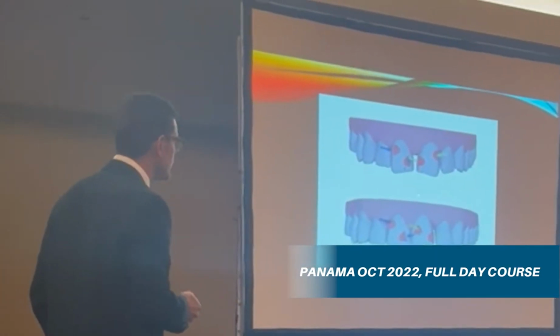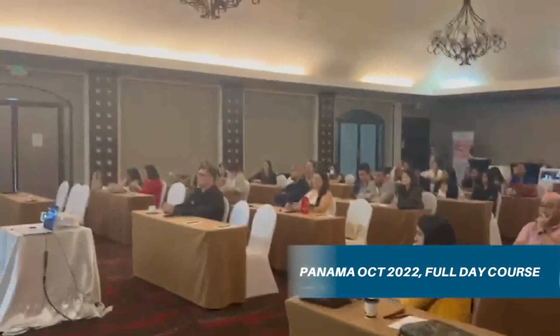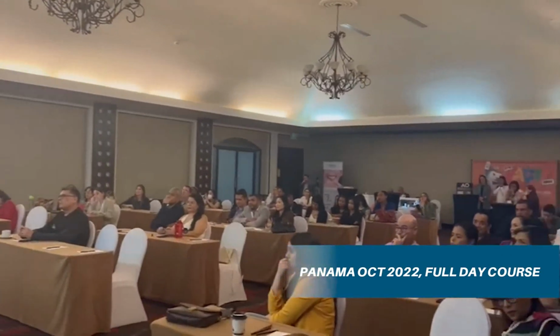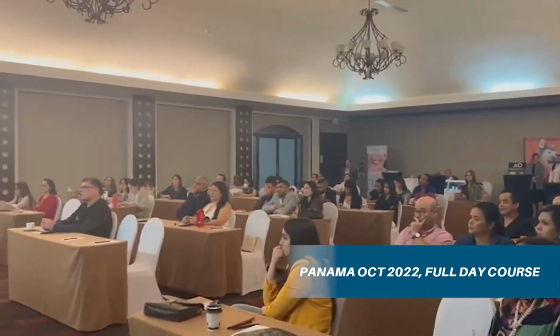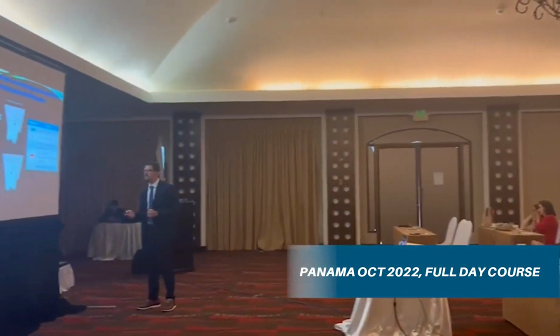From the occlusal view, look at the canine. Check the shape of the arch for good curvature, high protrusion, or lingualization. Remember that in general, patients do not like offset or inset.